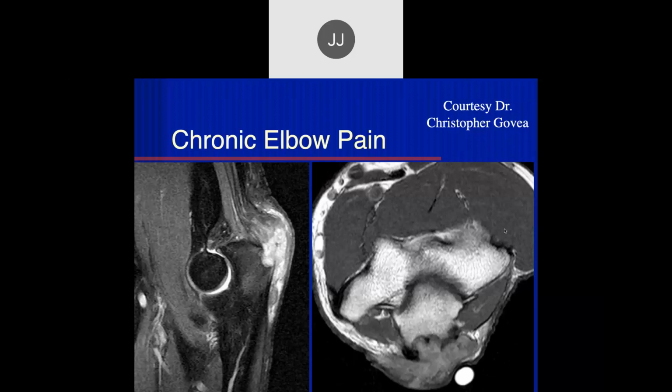I think earlier. Okay. Eliar, what do you think of this one? Chronic elbow pain in the olecranon bursal region. We see this soft tissue. There's erosion into the olecranon and maybe a tear of the triceps tendon. Okay. So this looks like gout as well. And what's the finding here that makes you most comfortable that this is gout? The involvement of the tendon and the erosion.